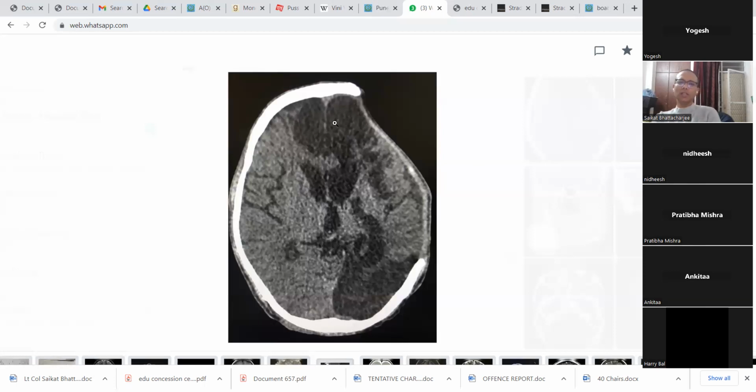Very nice. See, these areas are what you remember from the initial algorithm in which you first spot an abnormal black area. The next question you ask yourself is whether there is a negative mass effect or a positive mass effect. If it goes on to the positive mass effect, then you ask if this area of hypodensity corresponds to areas prone to injuries.